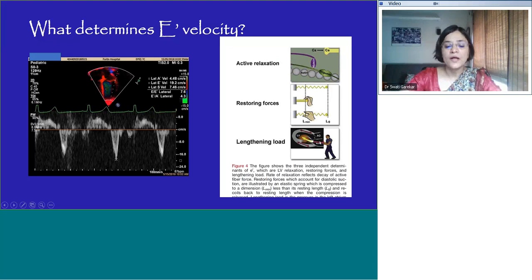Pretty consistently it reduces; it doesn't increase it as much. The relaxation suffers, that impacts the peak.